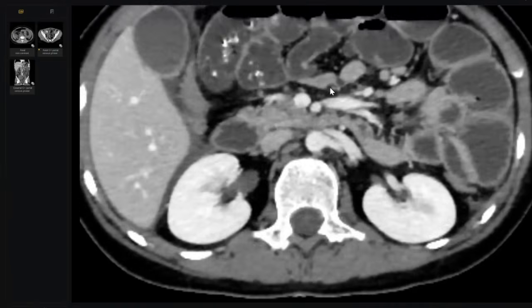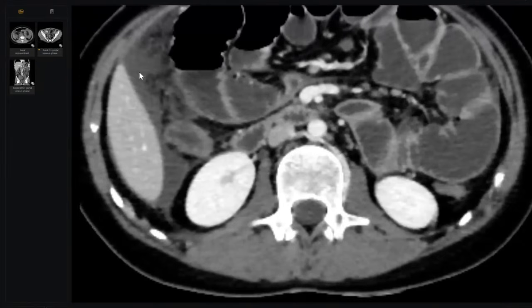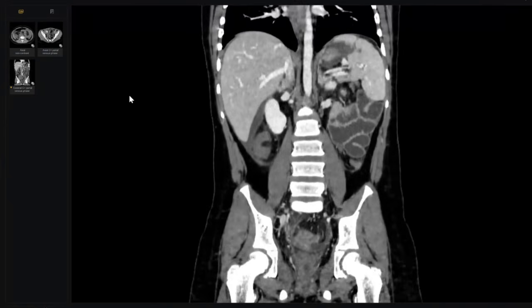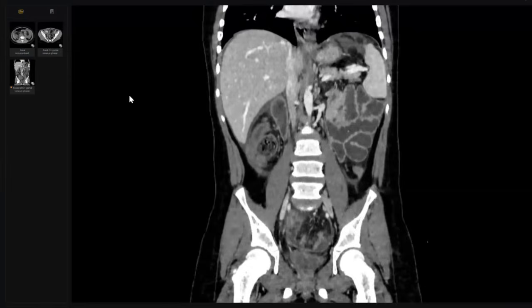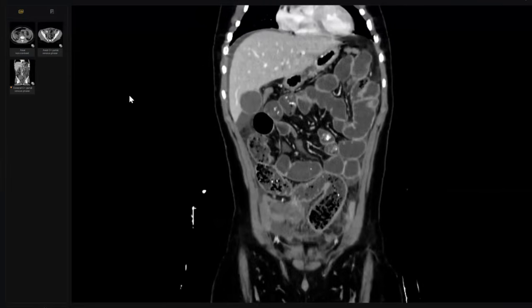So your final diagnosis should be, and besides that, see, what is this? Fluid. A very big evidence of the perforation. You made a mistake, doctor, when you didn't ask me to help you with other orthogonal views or other MPR views. Really, the examiner will not give you anything you didn't request. If you requested from the beginning, I think you must finish the case in half of this time.